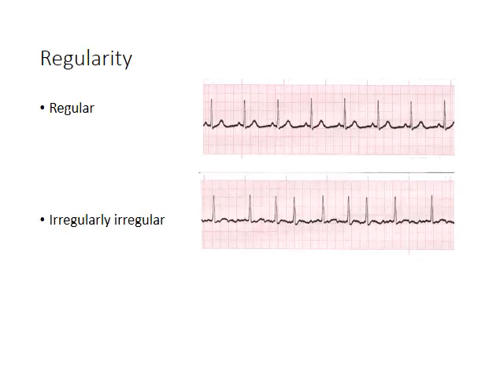When we're considering irregular rhythms, the example we saw on the previous slide was an irregularly irregular rhythm. What this means is there is no predictable pattern to the ECG. No matter where we were placing our marker, we were unable to line up our marks with the corresponding parts of the ECG complex. The example here being atrial fibrillation.